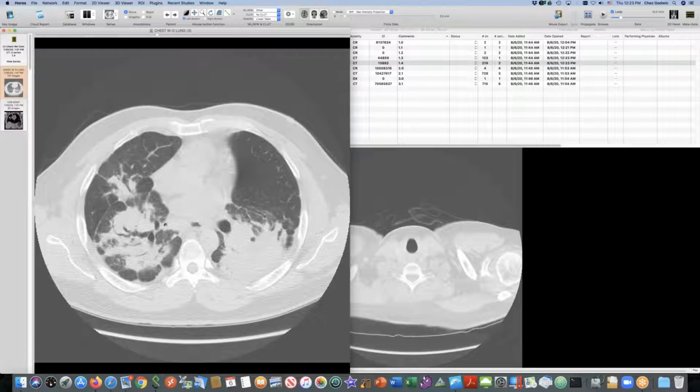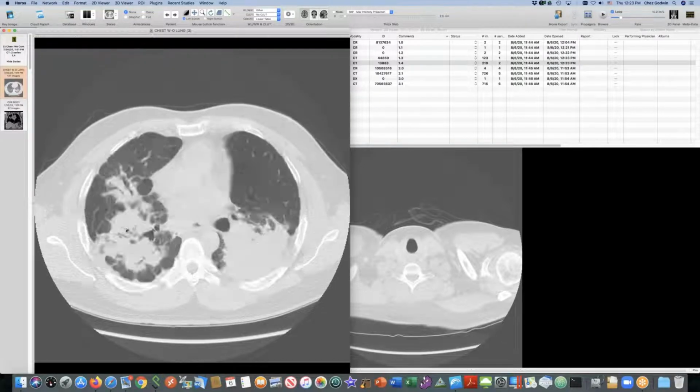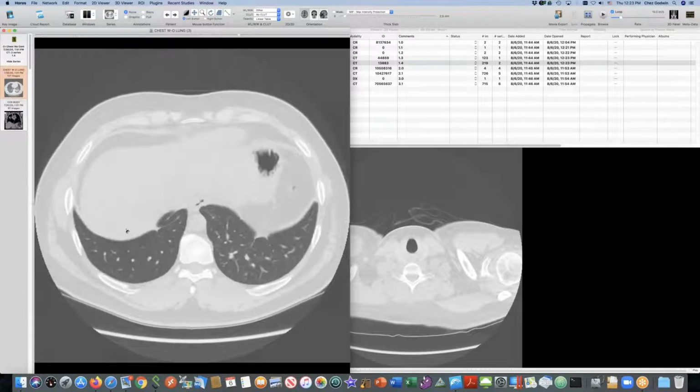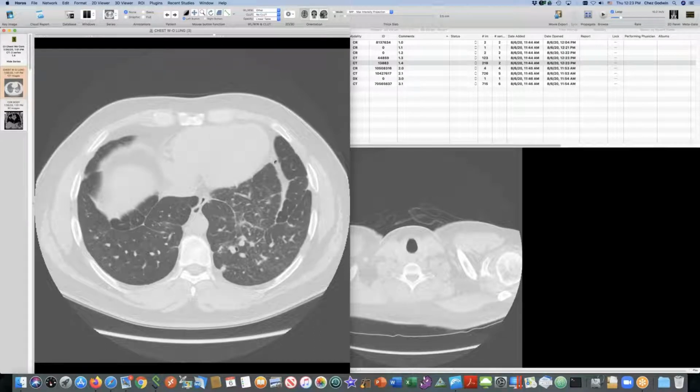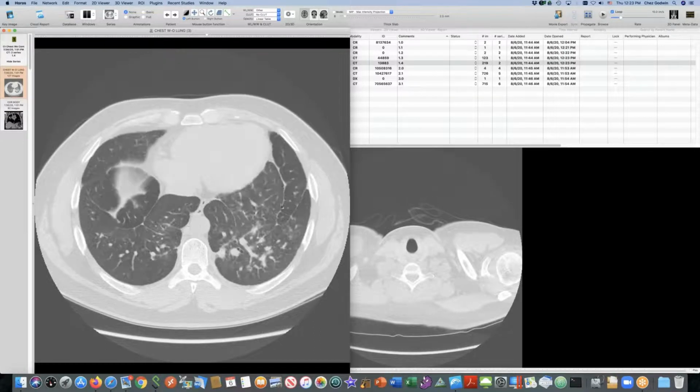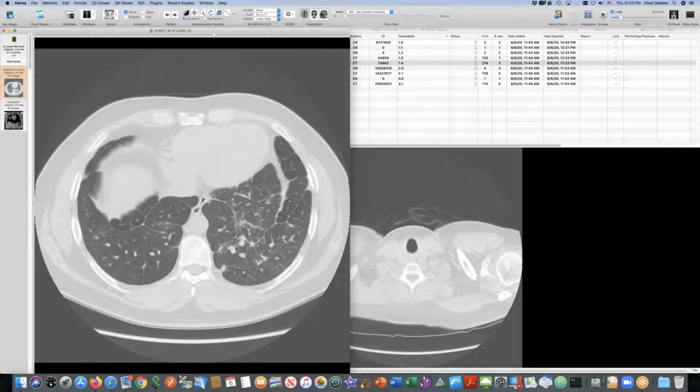And notice when this occurs, it actually pulls the smaller nodules into these big conglomerate masses. And here's the inferior accessory fissure. This is the inferior accessory fissure. Here's some fat on top of the diaphragm underneath the parietal pleura of the diaphragm. And this is what generates that juxtaphrenic peak. It's traction on the inferior accessory fissure, which contains the medial basal segment of the lower lobe. So this is the cause of the juxtaphrenic peak.